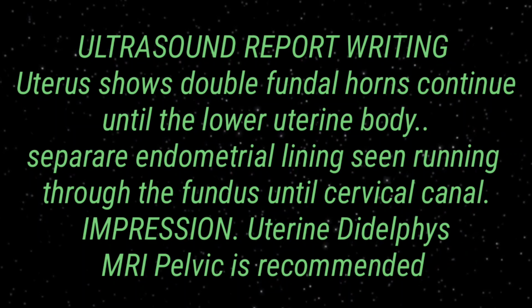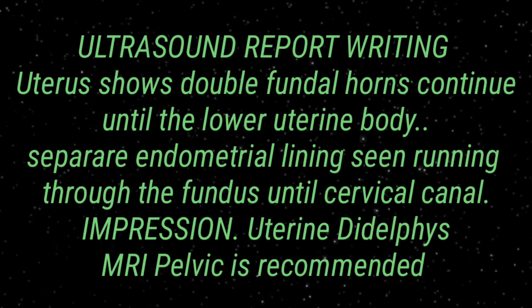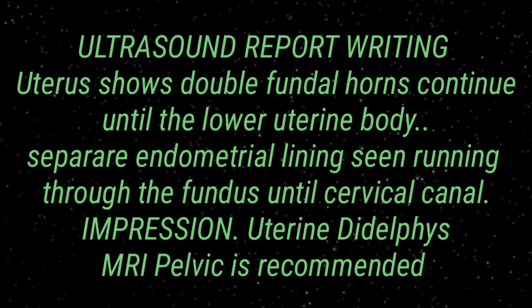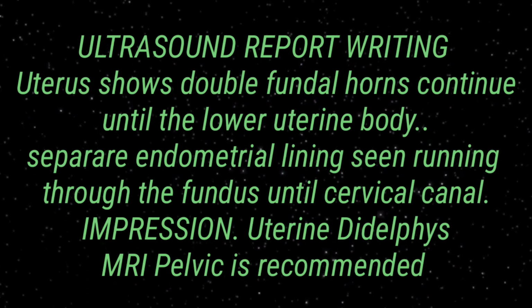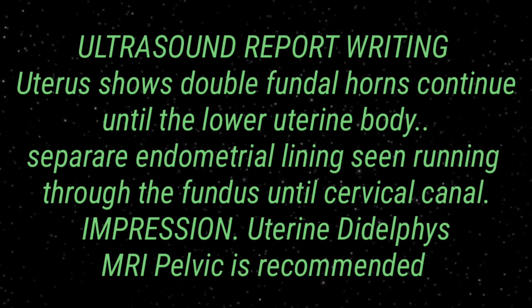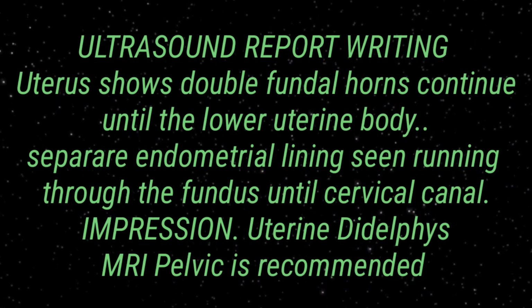After confirming all that, you should also mention that a pelvic MRI is recommended, because on the basis of the pelvic MRI you will be able to see whether the septum goes all the way down or is fused somewhere in the center, or what the status of the central septum is. So that's why the MRI scan is very important. So this is what the ultrasound report will look like, and you have to write this in the report.